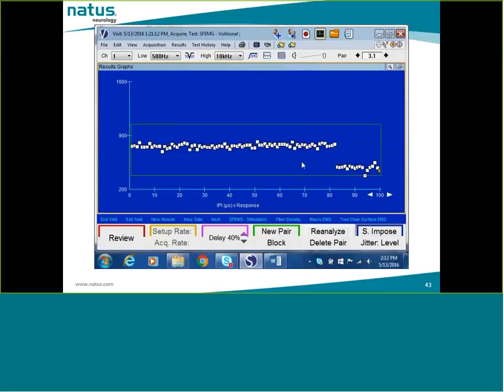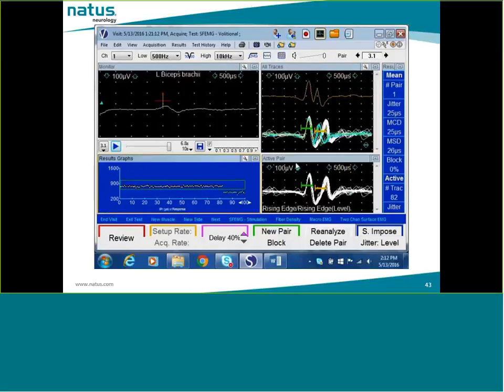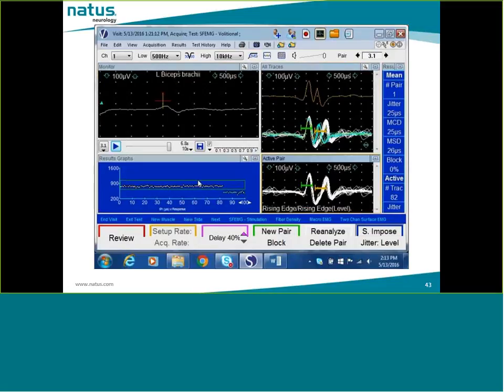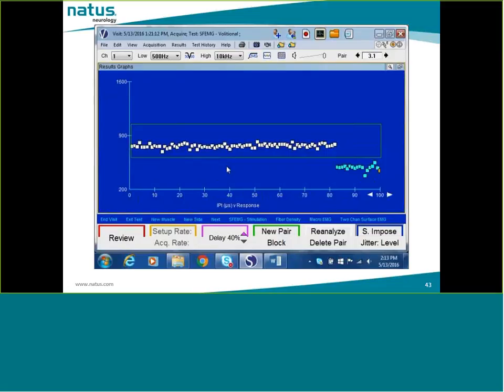We can adjust the limits of these windows to exclude data from the interfering motor unit. So if I want to analyze the data from this distribution, I will raise the lower limit. And let's look at the result. We have selected discharges from the motor unit that was discharging initially over here. If I change the limits, let me restore them.